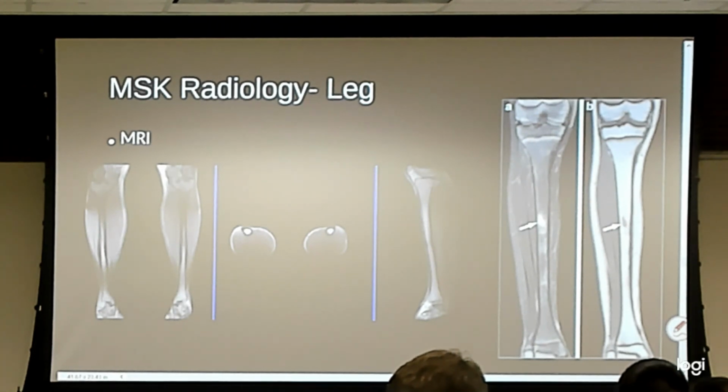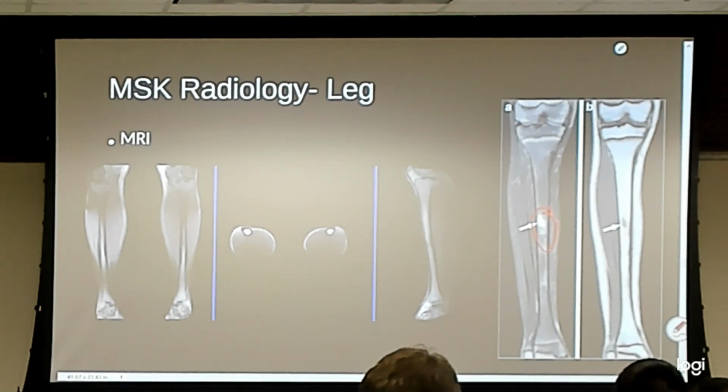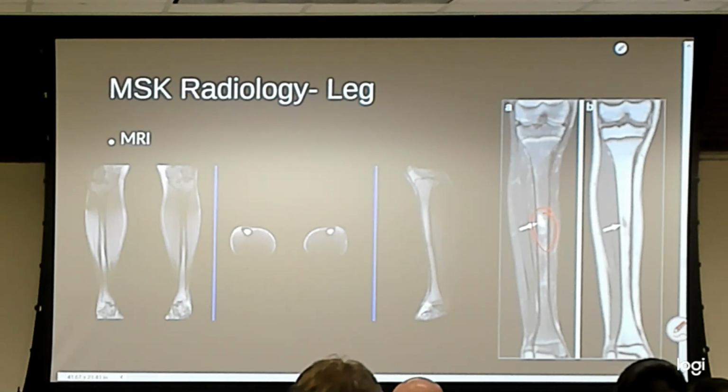Okay, MRI. I'm going to employ the MRI for the same reasons. So this particular capture here is of the tibia because I'm looking for those stress fractures, which is what I captured in that far right set of images at the arrow signs. So that bone edema we started talking about yesterday, all that extra fluid in this image here, that's bone edema, where we're looking for stress fractures.